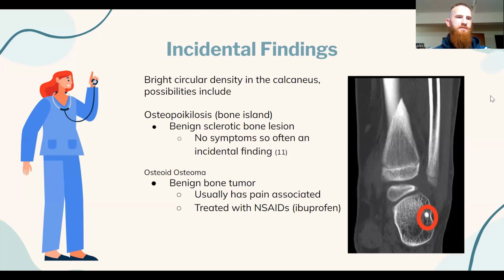However, due to its lack of symptoms or any harmful effects, it is often an incidental finding and not relevant to the patient's health. If the patient were to receive more imaging at an older age, the presence of more bone islands would confirm this, or prove that it is only a single bone island growth.